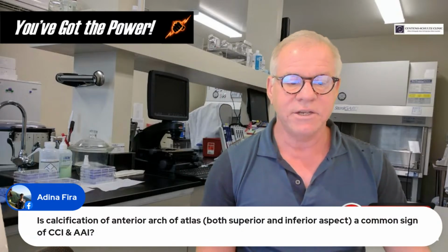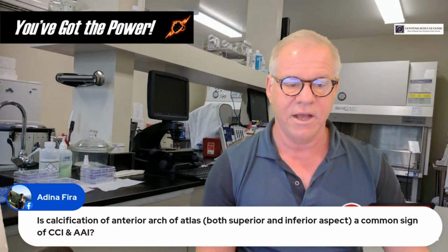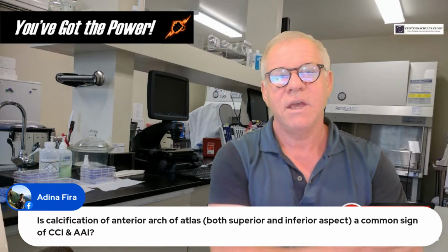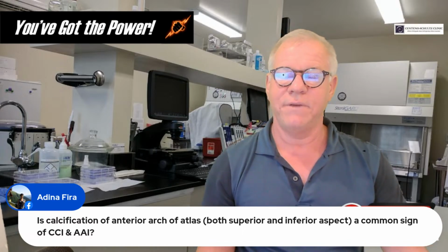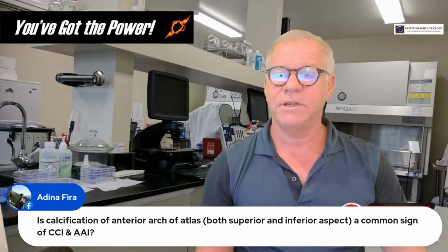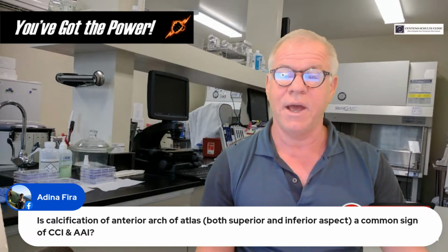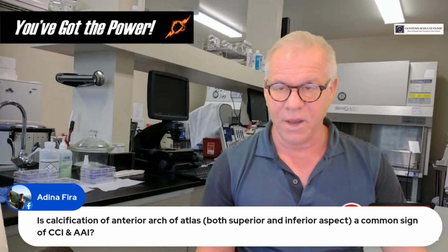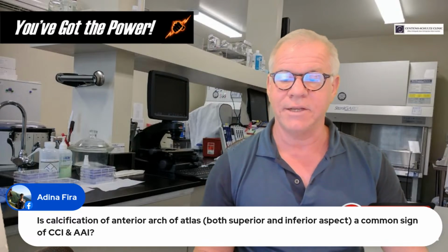Adina, is calcification of the anterior arch of the atlas, both superior and inferior aspect, a common sign of CCI and AAI? Yes and no. It depends on the age of the patient. If you see calcification in that area in a younger patient, I would submit that that's probably a good indicator that there has been instability there. If you see it, however, in an older patient, it's quite common when there's no instability. It's just normal wear and tear arthritis.